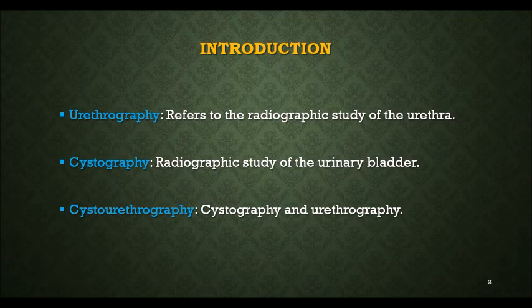Cystourethrography combines urethrography and cystography. Urethrography is a radiographic study of the urethra. Cystography is a radiographic study of the urinary bladder.